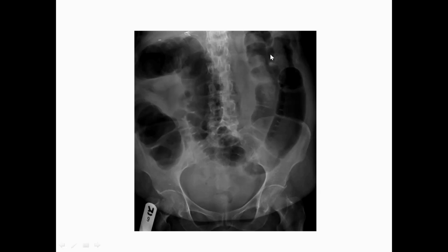So that's why all the upper part of the large bowel has been dilated, extending from the descending up to the, you can even see the cecum, and even this is the small bowel. Do you see this? Because there is an obstruction of the large bowel due to the anatomical structure, the small bowel will also be dilated. You see here, this is also small bowel, okay?